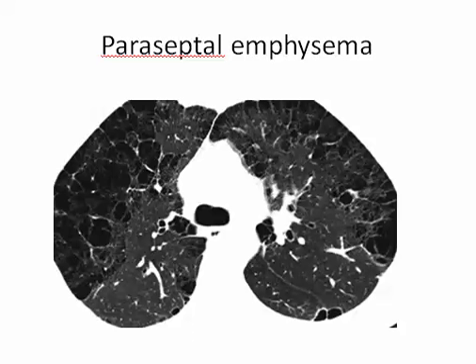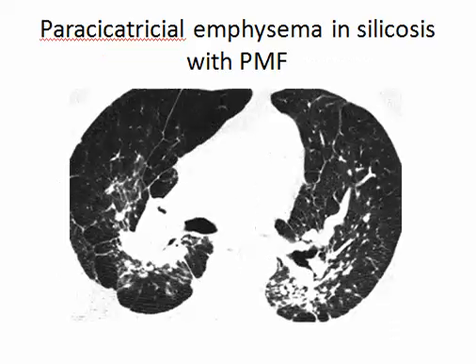And this is the pan-acinar, widespread translucency, may be associated with bronchiectasis affecting lower lobes, middle and lower lobes. And this is the peripheral type, or the paraseptal emphysema, where you can find bullae of around 1 centimeter in diameter, and it's mainly subpleural paraseptal. And this one is the cicatricial, related here to a case of silicosis with progressive massive fibrosis.